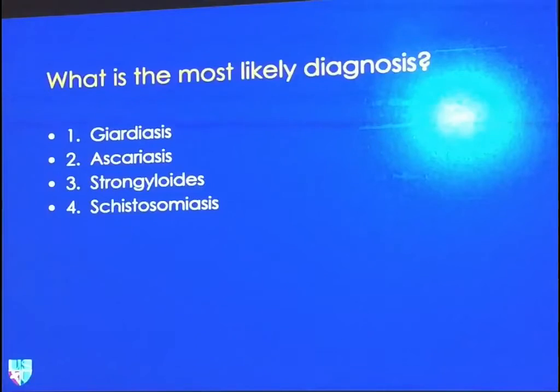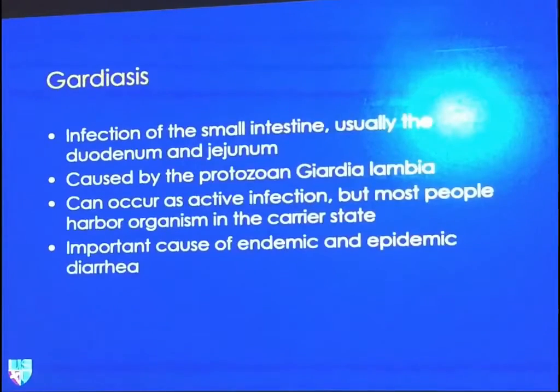All right, so what do we think is the most likely diagnosis of this? Strongyloides. Okay, that's one option. Give us another option. Giardia. Okay, good. So there are two possible options, and the answer is Giardia.